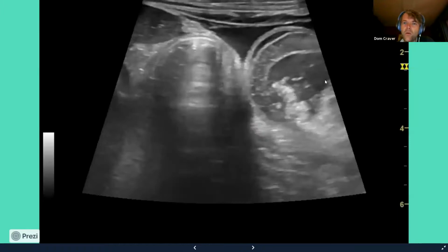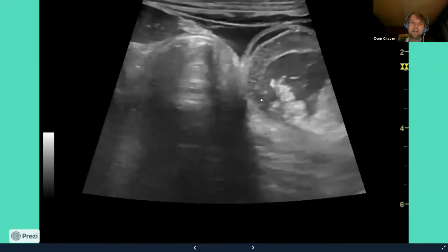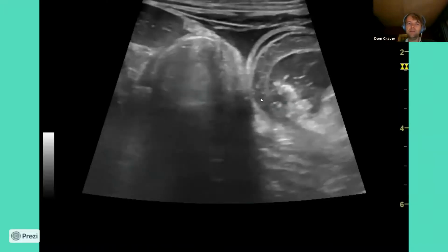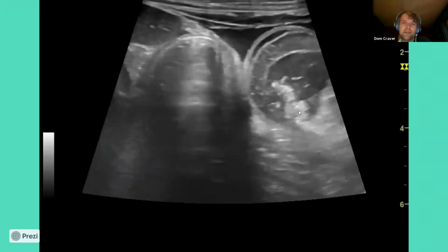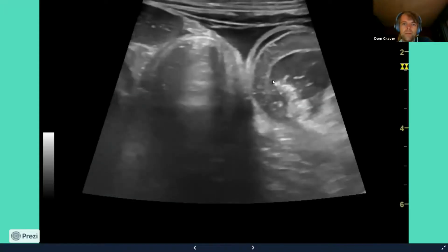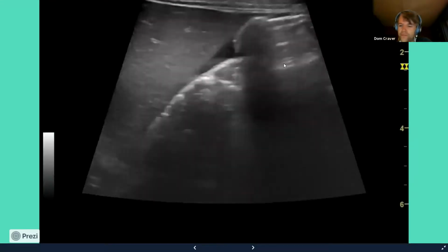And this one went all the way around the abdomen. It was everywhere. So unlike the other child, where it was just a small point in the left fossa, this was everywhere, and you could feel it. It was really impressive. Quite a bit of free fluid as well, and again, as it's around the abdomen, there's free fluid everywhere.